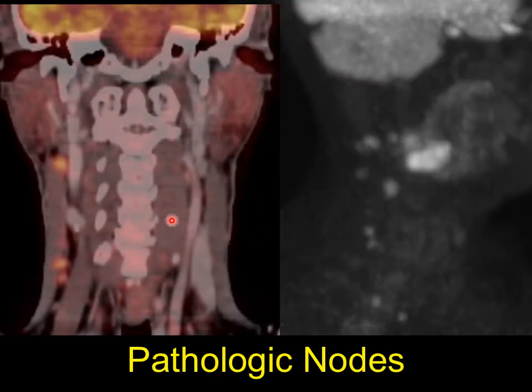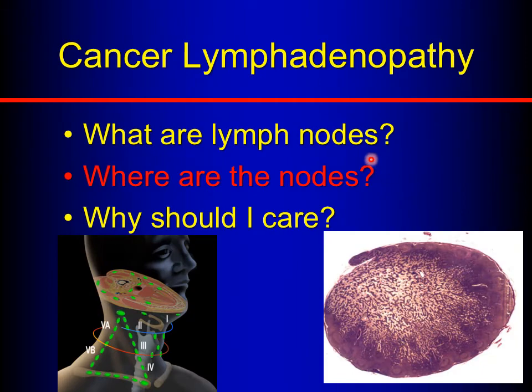Now here's an example of a coronal fused PET CT and the correlating PET image on the right. And we see all these lymph nodes. This patient had 15 lymph nodes throughout their cervical soft tissues that were all positive, but all under a centimeter in size. So it turns out if you just look at the pathologic specimens from neck dissections, sometimes about half the time, those lymph nodes that are all full of tumor may be under a centimeter in size. So it's much more important for us to look at the imaging characteristics of these lymph nodes. So that's what are cancer nodes.